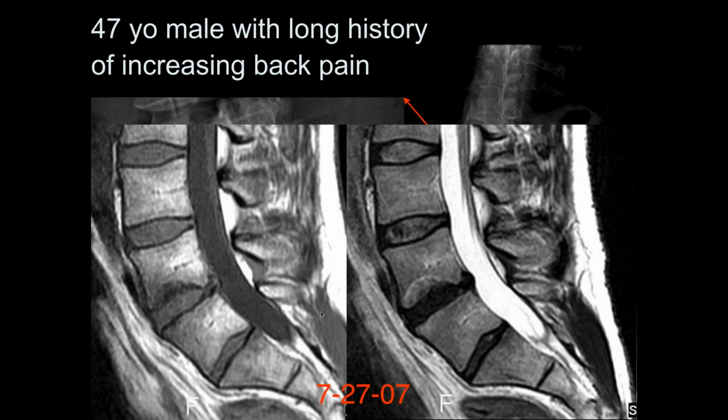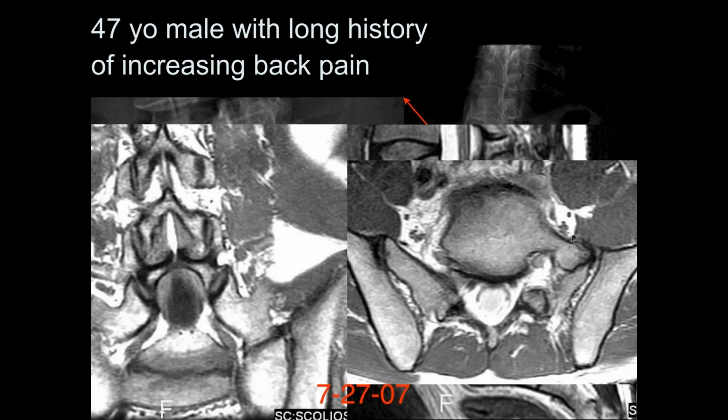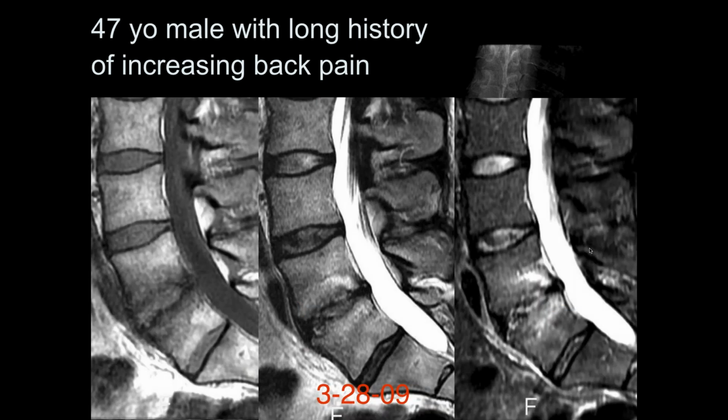And so here we can see clearly abnormality on this articulation, 07, on the left side. Okay, so this is 7/27/07. This wasn't described in the imaging reports at this particular time. Then the patient came back on 3/28/09, and this is what it looked like.